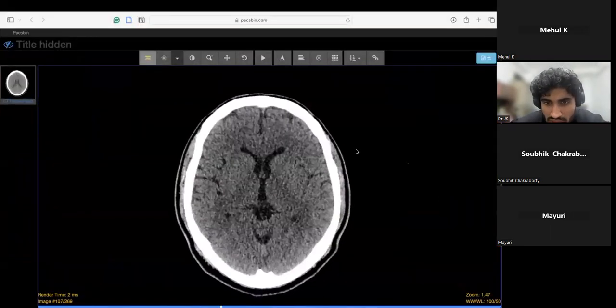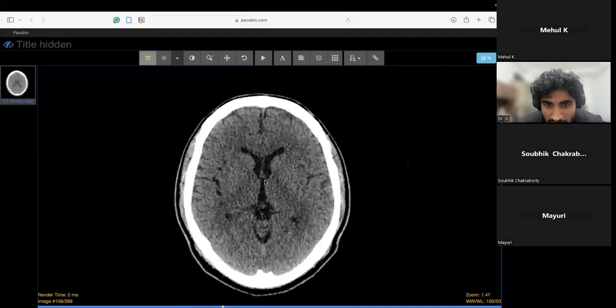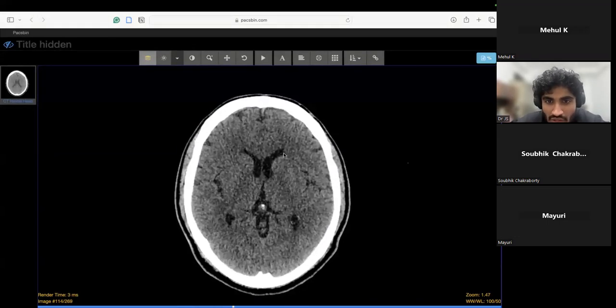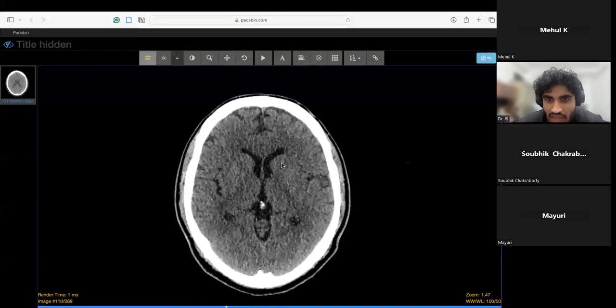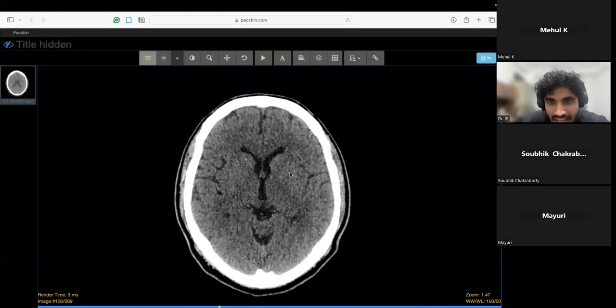Okay, so here you can see the lateral ventricle. Here we have the lateral ventricle draining into the third ventricle. Here this is the foramen of Monro. Then after that it will go into the fourth ventricle here. At this point you can see this part is the caudate nucleus. Here you can't appreciate it properly, and once we get to this part, can you appreciate the grayness? I can't appreciate it on my screen, but not sure. We can see a little bit, sir.